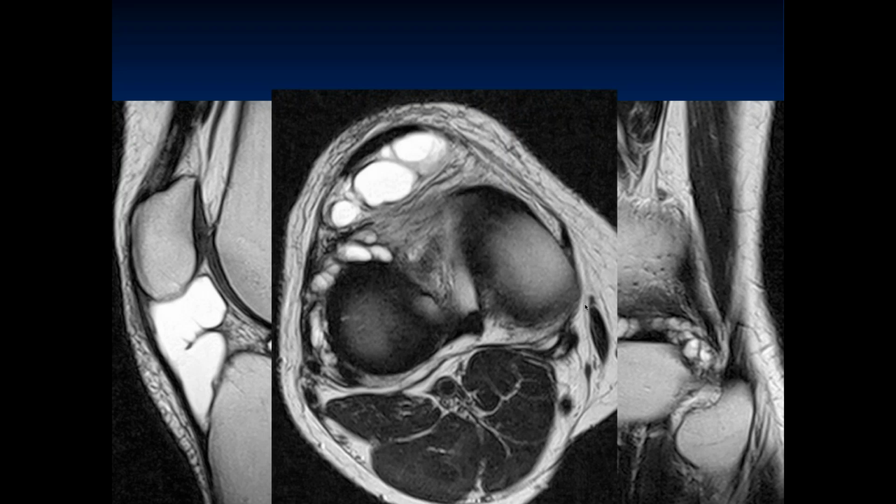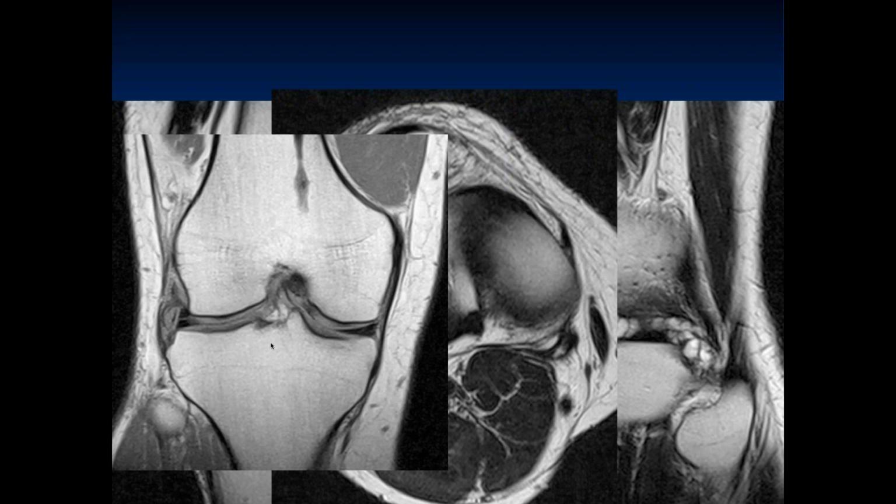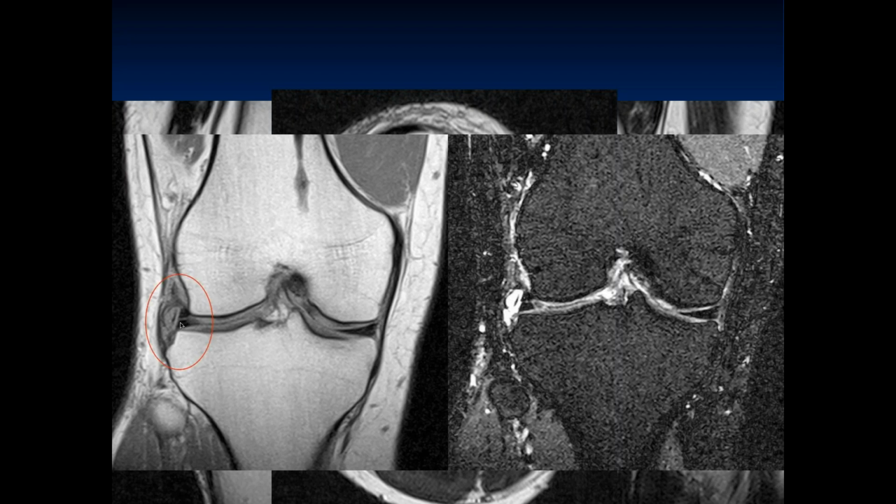There is cyst-like change along that anterior horn of the lateral meniscus. So this could be a very large parameniscal cyst. Yeah. And actually, there's the tear that's causing this large cyst right there. Again, it's a one-way valve, you get a lot of pressure, and it just can continue to grow in size because of that, unless you relieve the mechanism.